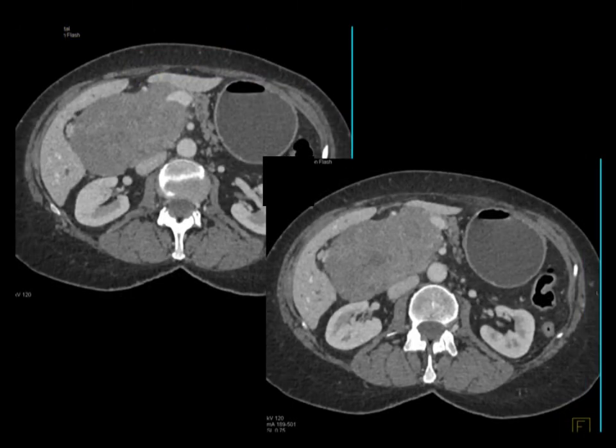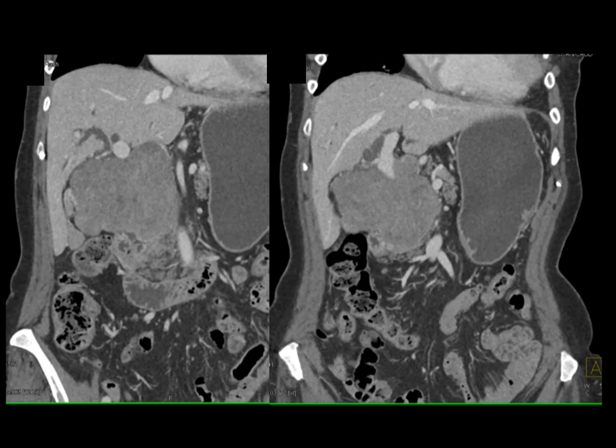Another example here with melanoma. Patient presents with jaundice and was sent for a pancreatic mass. And it looks like a big pancreatic mass, but there's no pancreatic duct dilated, and when you looked hard, it looks like the pancreas was pushed. What could do this? A large GIST tumor, maybe a carcinoid tumor, maybe some other malignancy. This was metastatic melanoma. And we've seen melanoma several times going toward the head of the pancreas with very large metastasis. And here's just a coronal view.